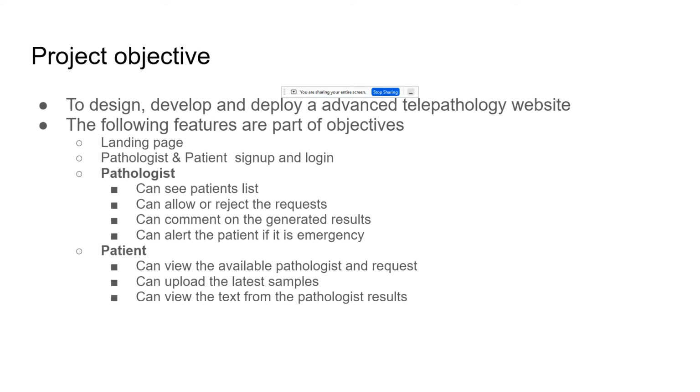Coming to our project objective, the main aim of our project is to design and develop an advanced telepathology website to assist pathologists and the patients. The main features of our project are that pathologists and the patients sign up and log in. We have a landing page.